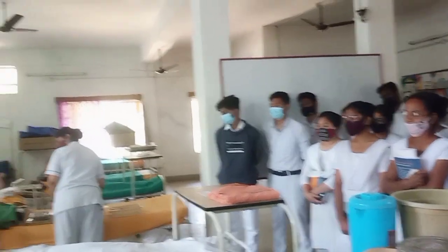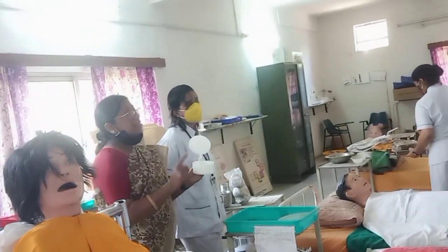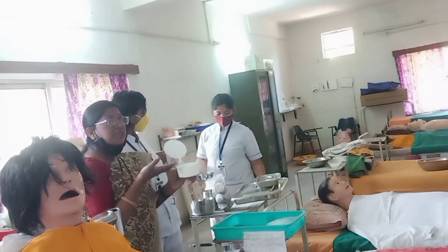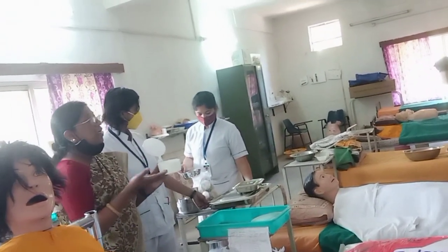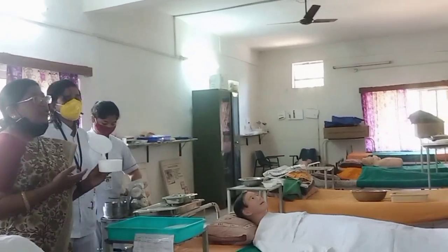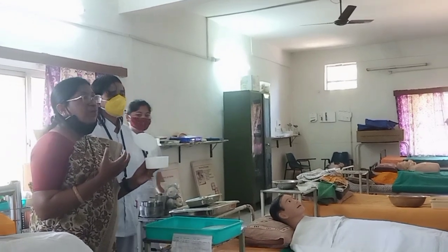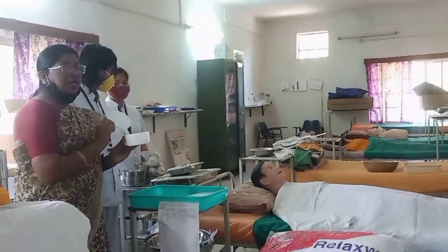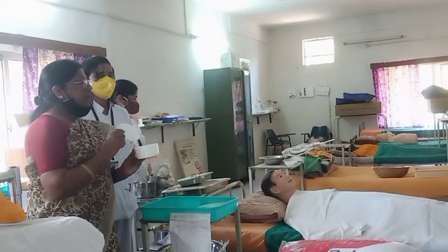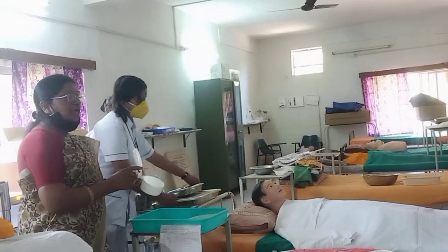This is a sputum mug. Why? To collect the sputum. If the patient is bedridden, अगर patient बिस्तर पे ही है तो पेशेंट को खांसी आएगी, तो पेशेंट क्या करेगा? कहीं भी थूक लेगा ना. तो पेशेंट को क्या करना, प्रोटेक्ट करना है, और पेशेंट को सिखाना है कि वो स्प्यूटम मग में ही स्पिट करे, और उसको आसानी से क्लोज करके we have to keep in another side.